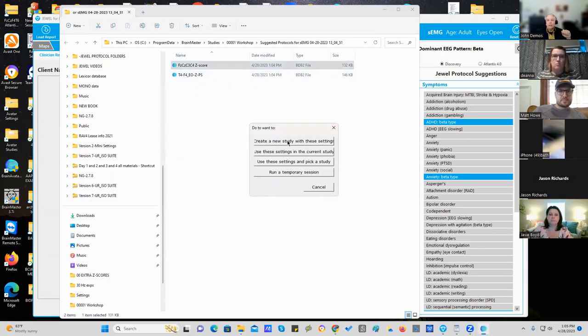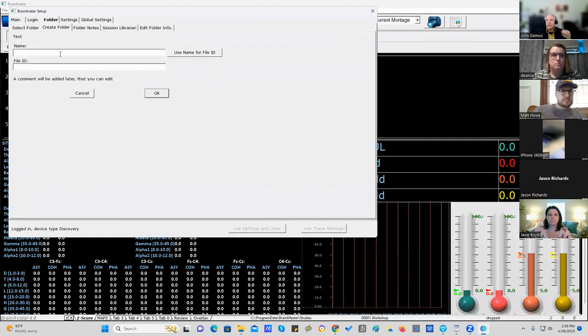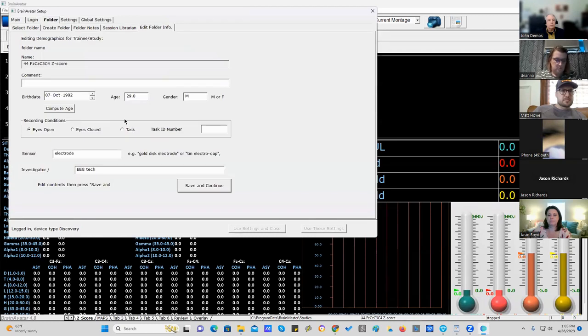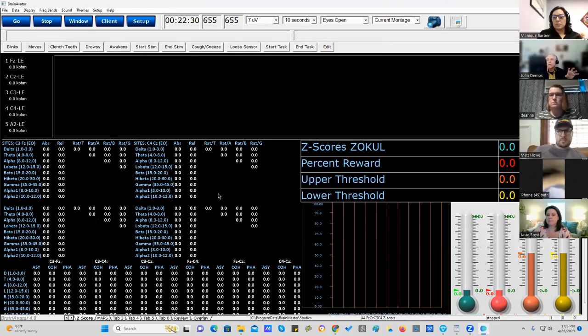I'm going to click on it, and it's going to open up Avatar automatically. And hopefully everybody can see Avatar. And we're going to give this person a name. And then I'm going to click paste. And there's the name of the protocol. And there's the person's age. I'm done. That's it. I'm ready to do my first client with Z-score training. I combined the questionnaire with the analyzed data, and here's the protocol, and I'm ready to go.